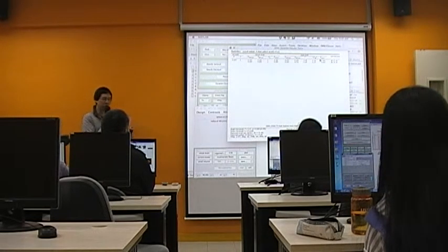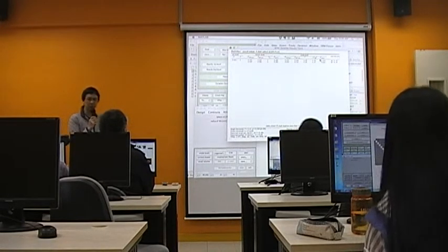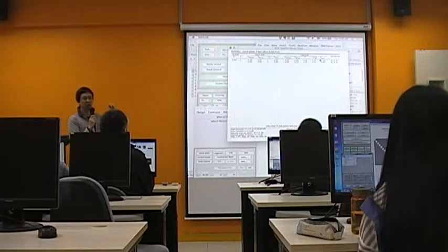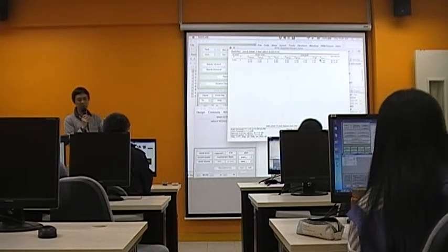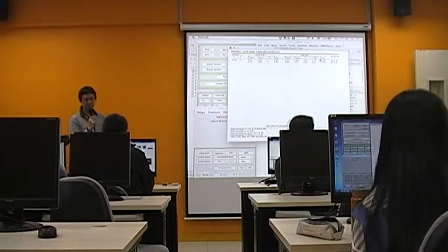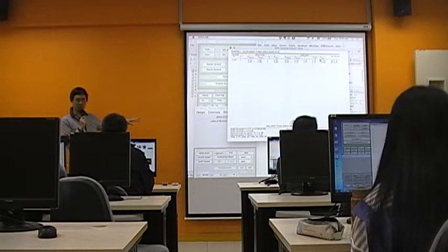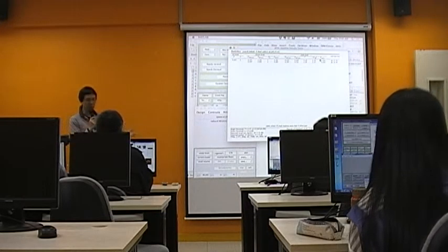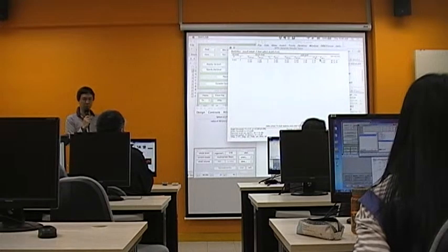We just don't want to screen out any potential activations before we go straight to take a look at the small volume, the a priori region of interest. So you should not use too high a threshold for data exploration in this case. Otherwise, you won't be able to see whether there might be something important, or you will miss something.